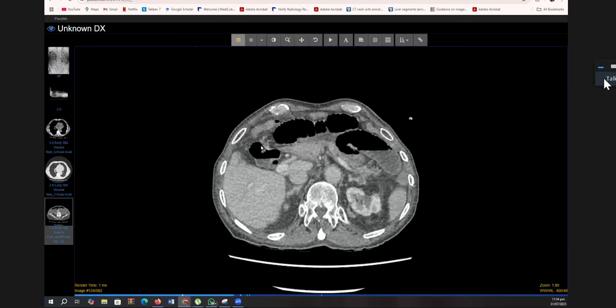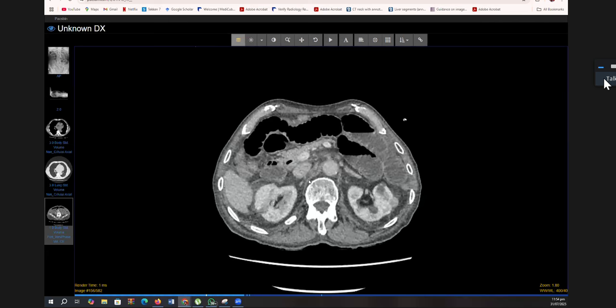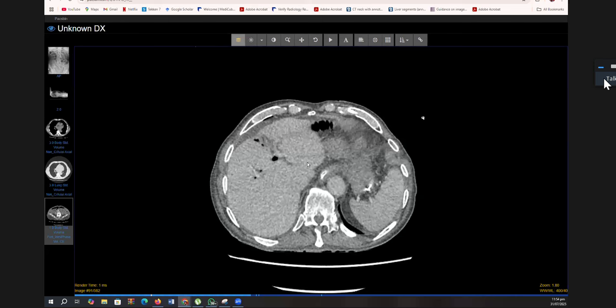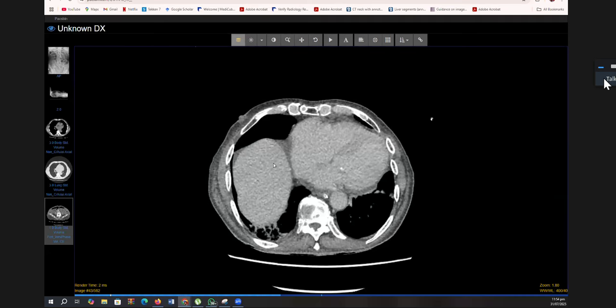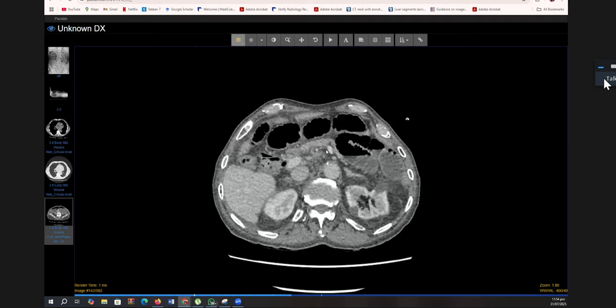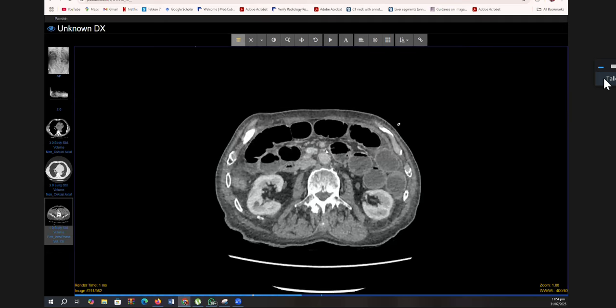You can see here that we've got dilated small bowel, and there's pneumobilia. What does that make you think of? Sir, if there is pneumobilia and dilated bowel, gallstone ileus would be in my mind, with a cholecystoenteric fistula. Always think about that. But in elderly people could have pneumobilia for other reasons, like a lax sphincter of Oddi.